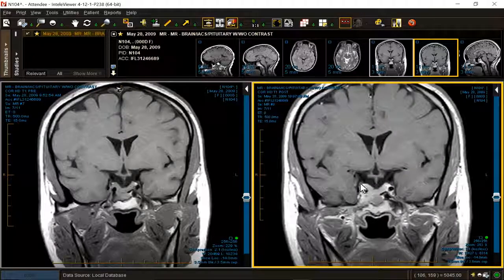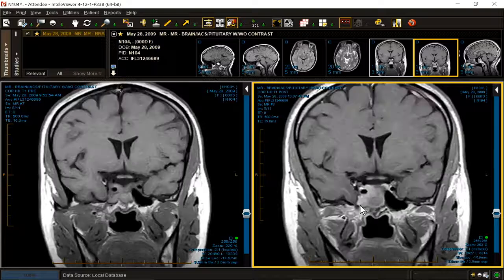Abutment, flush abutment, greater than 1.5 centimeters of the lateral dural sinus wall is said to be another sign of cavernous sinus invasion, and this exhibits that. And in my experience, the circumscription rule is less valuable than the abutment of the lateral cavernous sinus wall rule.